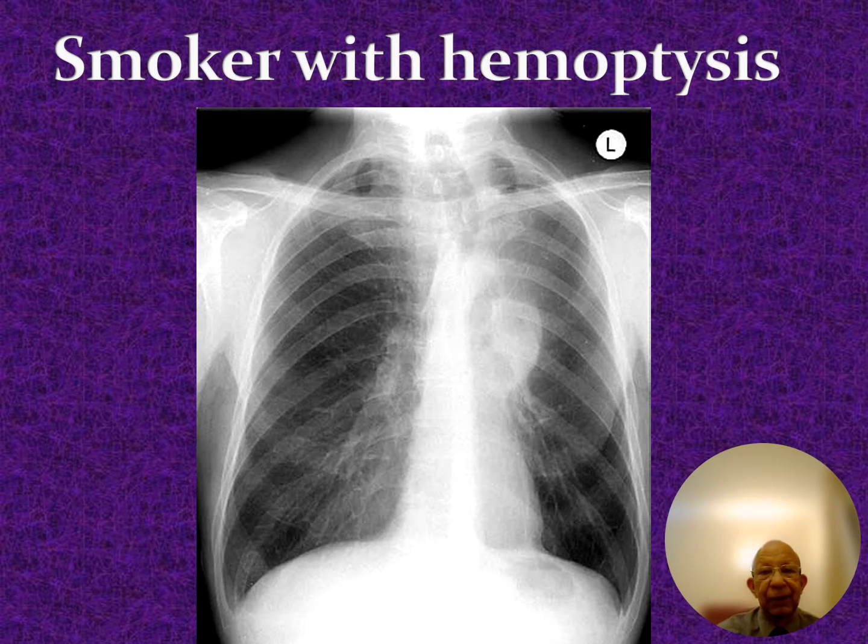Now let's look at this. Now you can see here that the trachea is deviated to the left. Now if it's deviated to the left, it is either pushed or pulled. Now it could be pushed by a large pleural effusion or a tension pneumothorax, or it could be pulled because of a collapsed lung, okay, on the left side, or collapsed lobe on the left side. So you can see that with this trachea the rule is broken and it's now shifted to the left side.